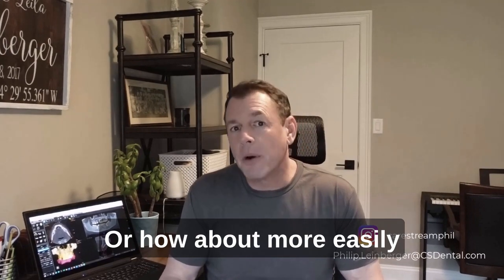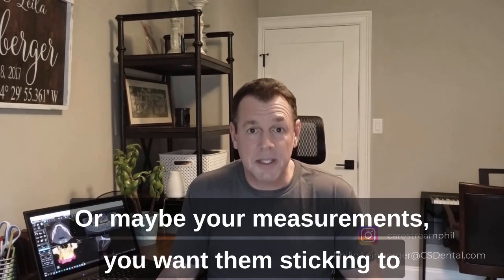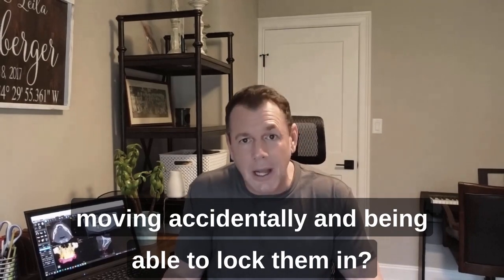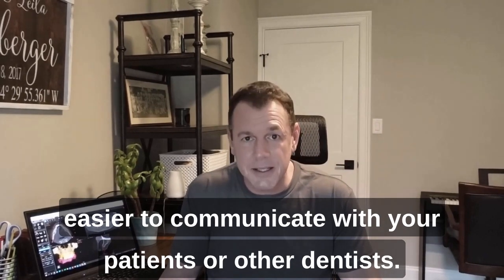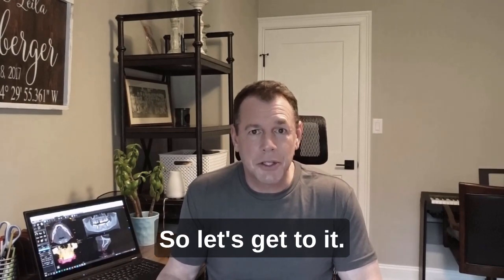Or how about more easily creating multiple treatment plans? Or maybe your measurements, you want them sticking to the actual slice. Or your crowns and implants not moving accidentally and being able to lock them in. Or a bunch of new annotations to make it easier to communicate with your patients or other dentists. All of that and more in this upcoming video. Tons to get to, so let's get to it.